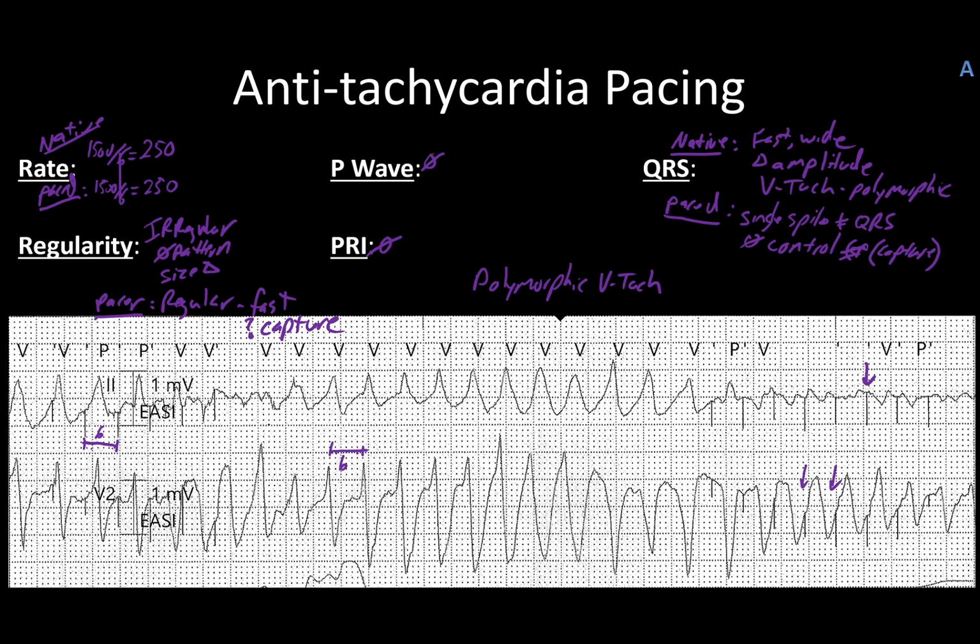Now, where this leaves us is in a bit of a rough spot because it's impossible to differentiate the anti-tachycardia pacing from runaway pacemaker. There's a chance that something went wrong with the pacemaker setting and that's what's causing all of this to happen, whether it's pacemaker mediated or whatever you want to go with. Ultimately, it comes down to what we always say, and I'll write this in bright red: treat the patient.